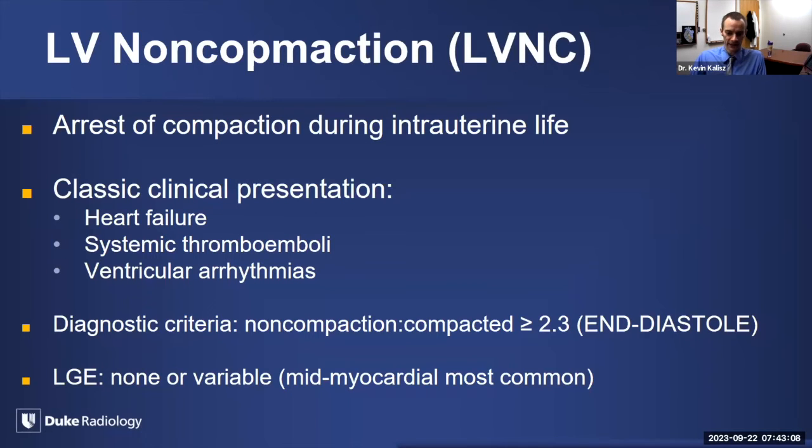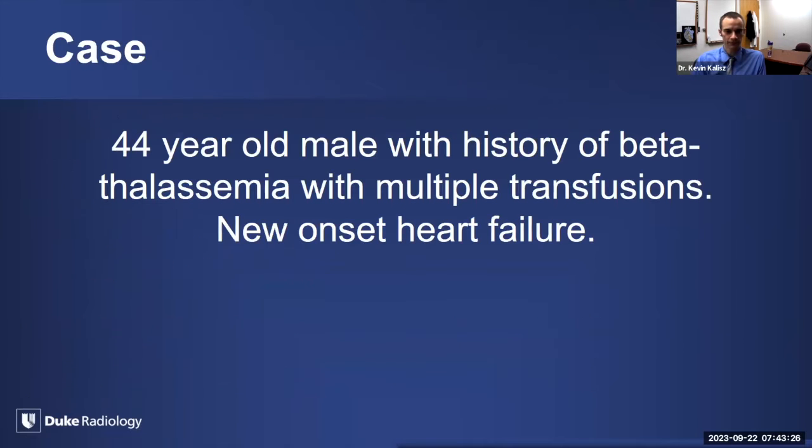Again, the diagnostic criterion is the morphologic ratio of non-compacted to compacted myocardium, emphasizing this should be measured in end diastole. LGE can be completely normal, but if you do have LGE, the most commonly described pattern is mid-myocardial, but again, it could very well be normal.